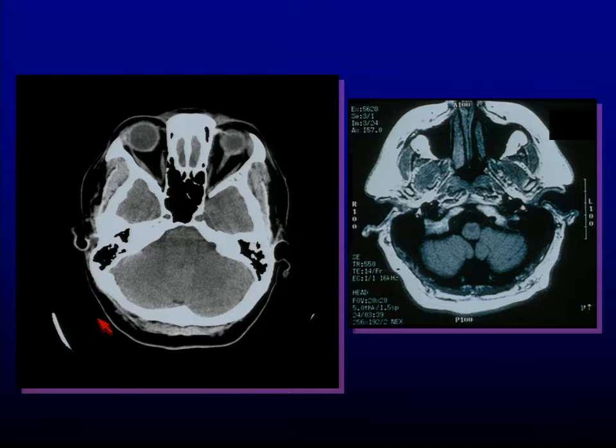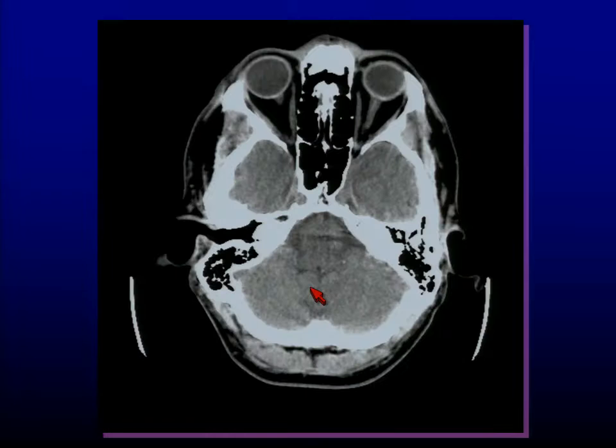But on the other hand, as we go through and look at pathology, I can find major bad things in the posterior fossa. If I have a big hemorrhage, I'll see it back here. If I have a big stroke, I'll see it back here. If I have a big tumor, I'll see it back here. I probably won't see as much subtle detail as I would in an MRI, but again, if you work at least at a shop like mine, I cannot get MRIs like that. It's a fairly big deal.